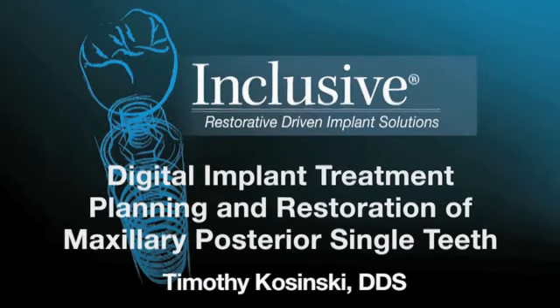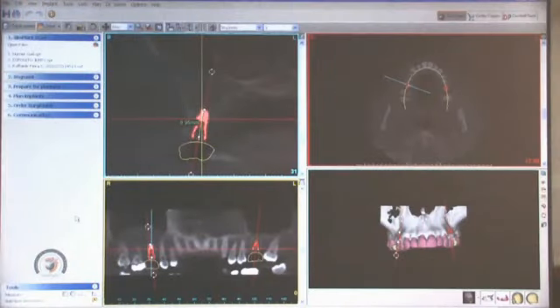Here we utilize Glidewell's digital treatment planning services, and the following is a recording of the web-based teleconference that was conducted to review the digital plan. This simplifies the process in making sure that we're able to visually determine the position of our dental implants prior to any surgical intervention.